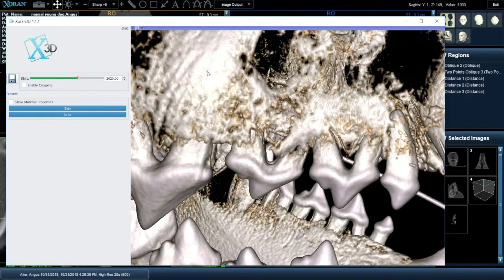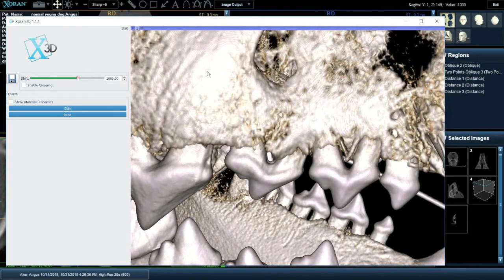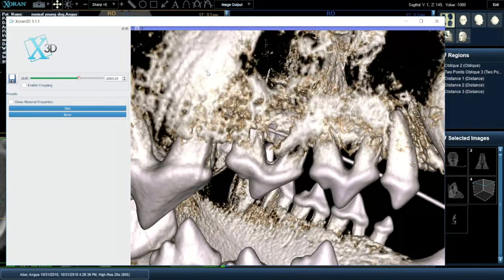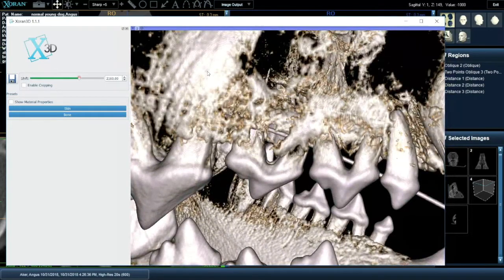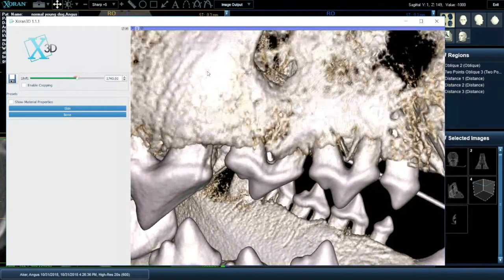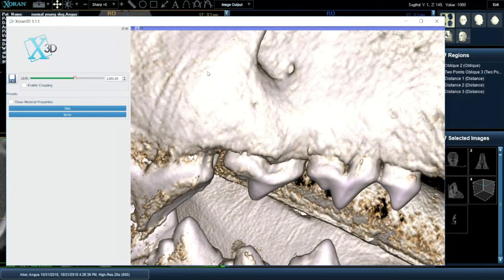So if I actually peel away the bone artificially by shifting the segmentation of this 3D rendering, I can make this situation look a lot more advanced than it actually is. In fact, it's to the point where we can uncover the roots and almost artificially look at the roots independently from the bone level. So that is a little risky.